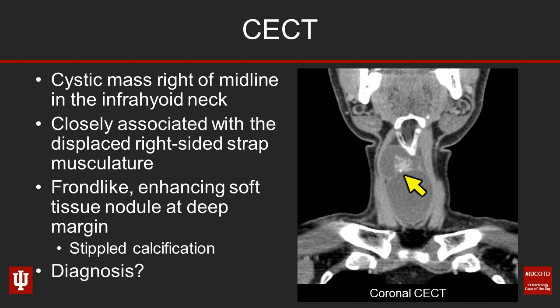So, what's the diagnosis in this case? And what's your next step in terms of something that you as a radiologist can do to try to add some more specificity to this diagnosis?